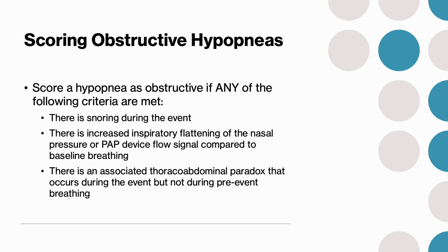Scoring hypopneas as central or obstructive is optional, but personally, that seems like a horrible idea not to specify which one, because that can totally change the treatment. Score them as central and obstructive unless your lab tells you not to.